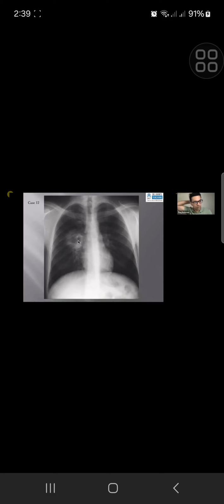If this patient has long history of previous inflammation, like Wegener's, which in this case there is not. In chronic pulmonary vasculitis kind of picture, the rest of the lung will be scarred. They get recurrent respiratory infections with cavities, but the rest of the lung is quite clear and pristine in this case. So that's not a picture here. Does that make sense? So instead of enumerating all the differentials, give the examiner the choices of clinical scenarios and fit each diagnosis into different clinical scenario. Does that make sense? That makes sense. Thank you, Dr. Rahman. Excellent.